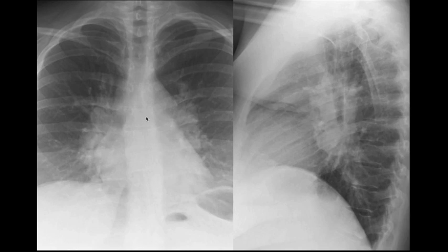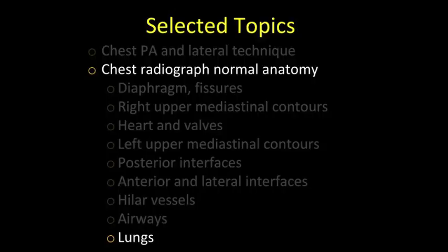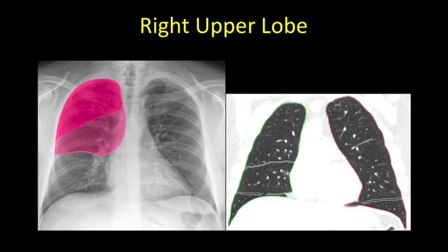And here's an example of bilateral hilar adenopathy. There's also mediastinal adenopathy in the AP window, but we can see the soft tissue density in the infrahilar window, which we don't see normally, and this is an indicator of adenopathy. So let's review the lungs. This is important to understand so we can localize pathology to different areas of the thorax.